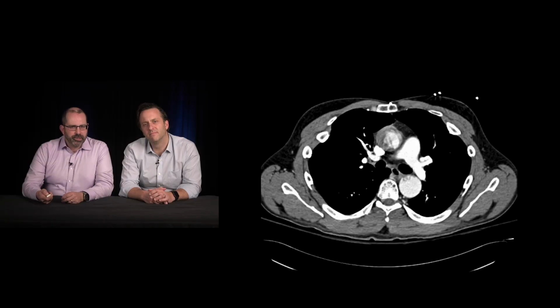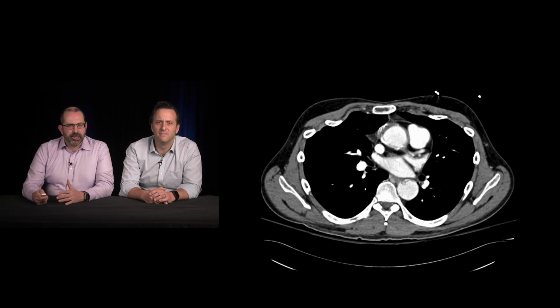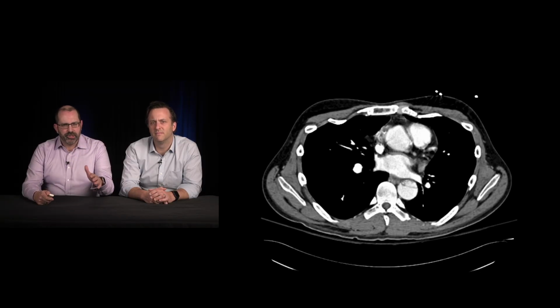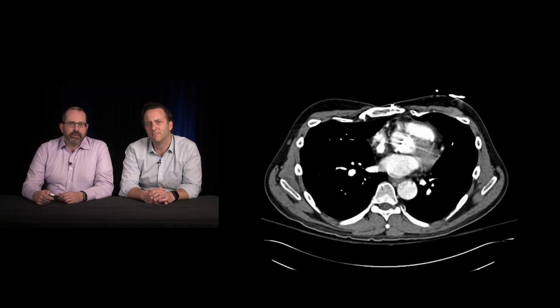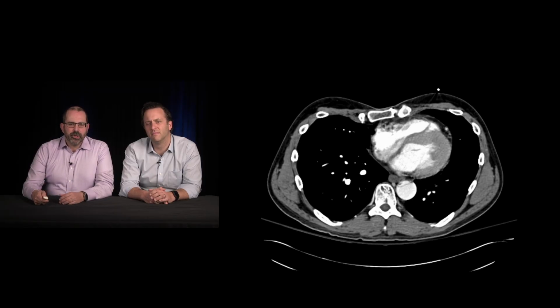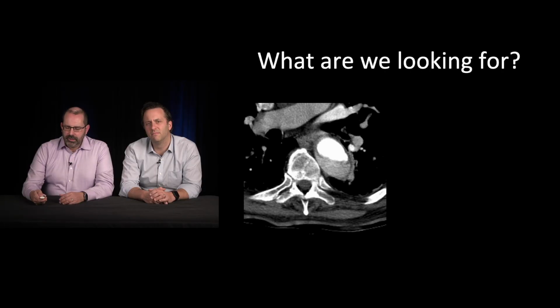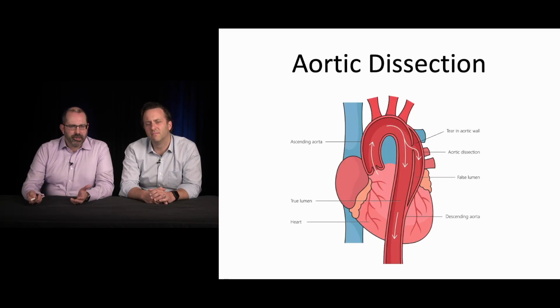This was an unfortunate patient with Marfan's. And he came in screaming his head off and really just hemorrhaging out of his GI tract. Severe abdominal pain, severe chest pain. And as you look, it just keeps going on and on. And so obviously we're talking about an aortic dissection here.